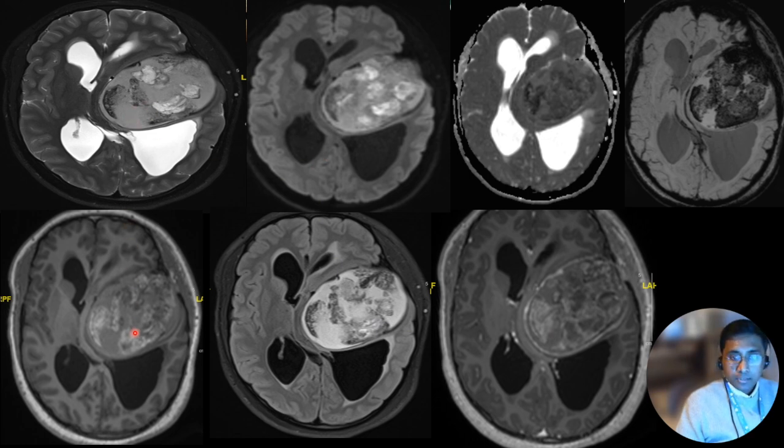If you look at the bottom sequence, we can see this is not a fat suppressed sequence. It's just a plain T1 axial image, and we can see that these areas are quite hyperintense in T1. And if you see the axial T2 fat suppressed sequence on top, all those areas have become suppressed. So the diagnosis is clear cut here. It becomes intracranial teratoma, and one of the complications of intracranial teratomas is rupture of the teratoma and aseptic meningitis. So it's important to remember to look at all the sequences we have available before reporting the scan.